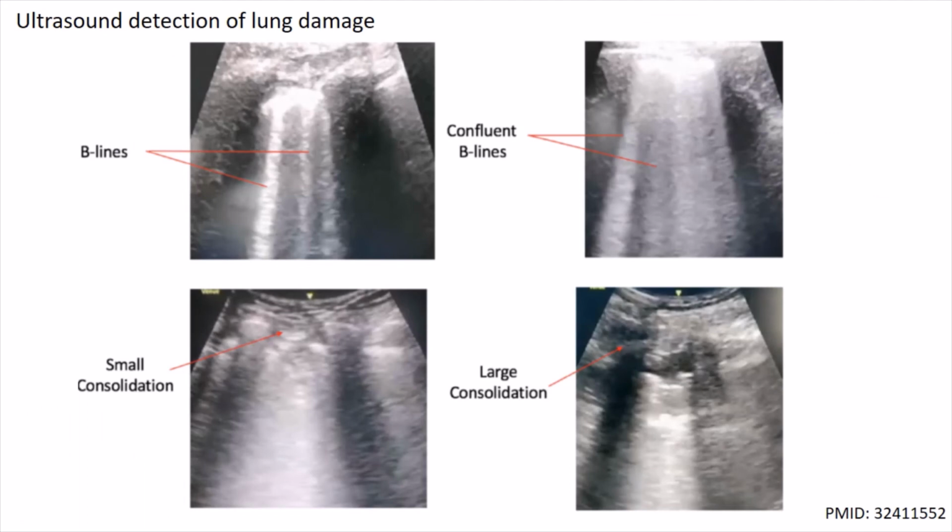Lung ultrasound can detect changes in superficial lung parenchyma with greater accuracy as compared to chest X-rays and can, therefore, play an important role in triage, diagnosis, and prognostic stratification of patients in the emergency room and intensive care unit setting. Ultrasound findings in patients with COVID-19 pneumonia correlate with CT findings, which signifies that lung ultrasound could be useful for early diagnosis of COVID-19 pneumonia in patients presenting to the emergency room.